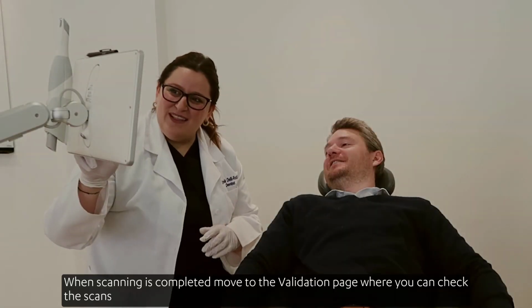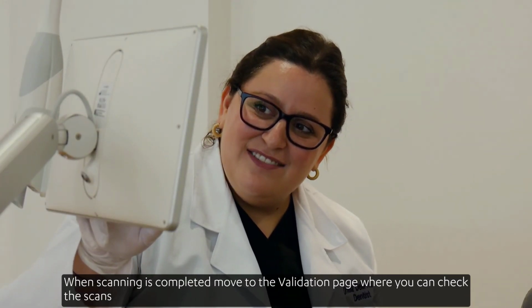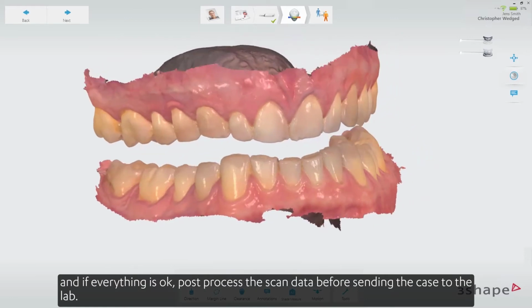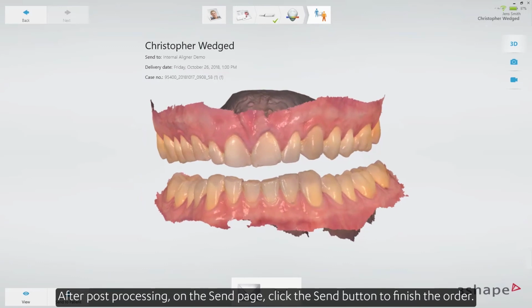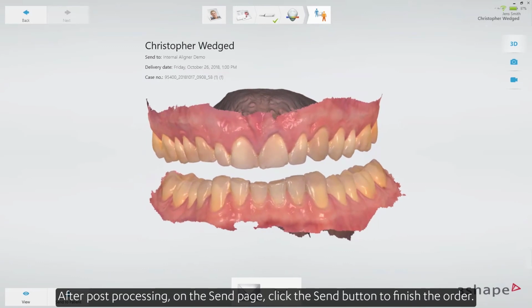When scanning is completed, move to the validation page, where you can check the scans and if everything is okay. Post-process the scan data before sending the case to the lab. After post-processing, on the Send page, click the Send button to finish the order.